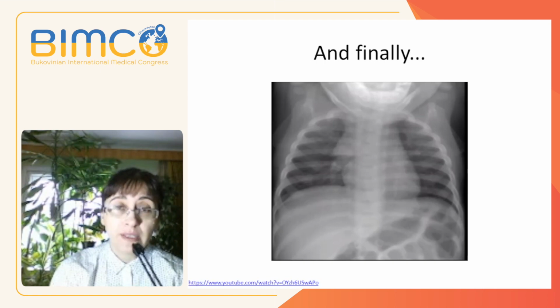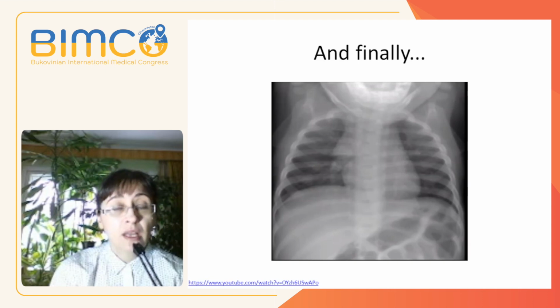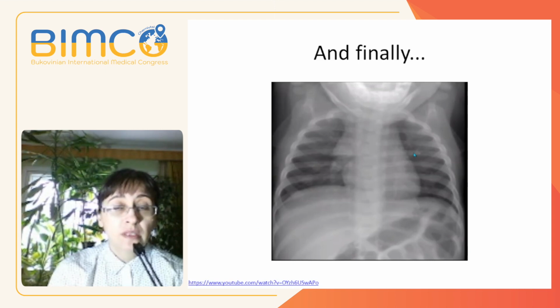And to summarize, guys, all information we have discussed today. How to interpret chest X-ray in children. First of all, remember about physiological age-dependent findings which may be observed only in this age group. So first of all, it is the thymus, which may cause a misinterpretation, and you may suspect pathological findings, but it is normal physiological findings. So the thymus.